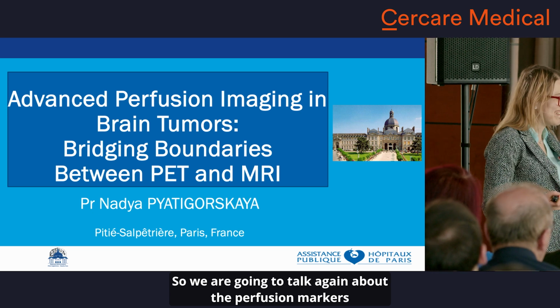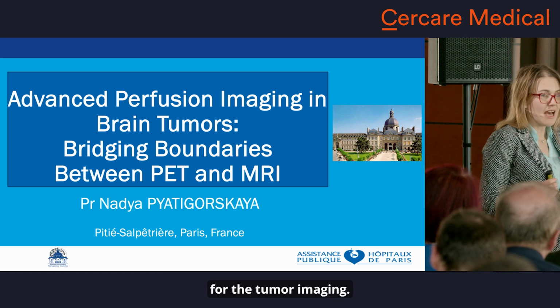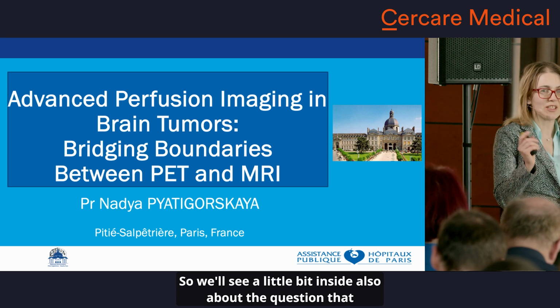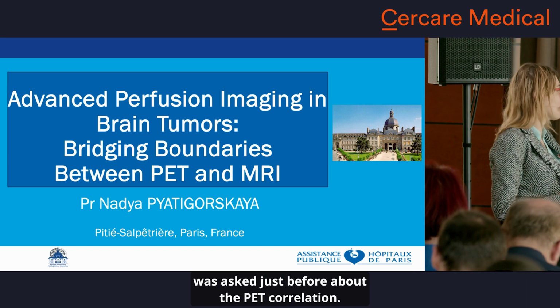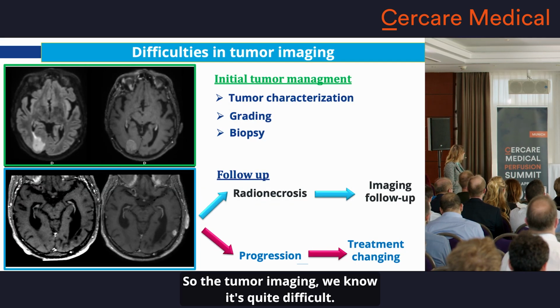So we are going to talk again about the perfusion markers for the tumor imaging. So we will see a little bit the insight also about the question that was asked just before about the PET correlation. So the tumor imaging, we know it's quite difficult.